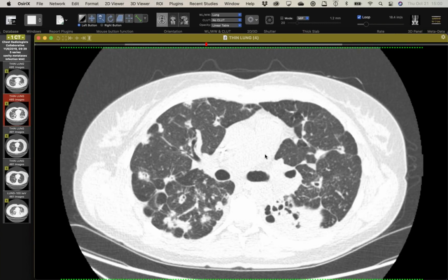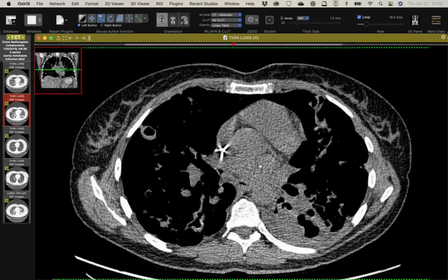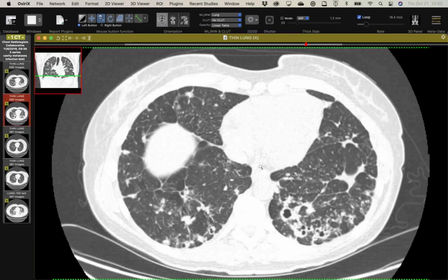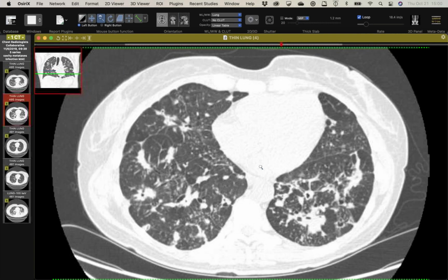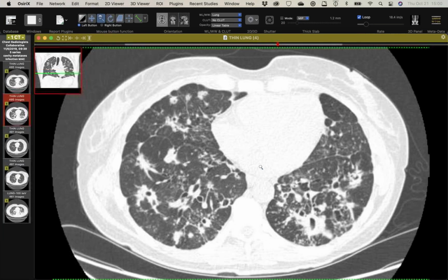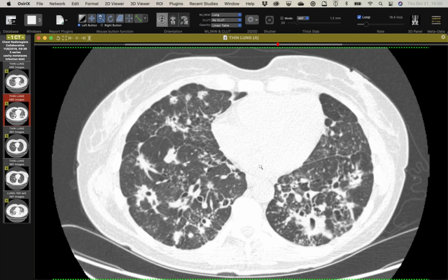Normal. Okay. Yeah, I think she could well be colonized with, say, Pseudomonas. You can get a diffuse small airways sort of thing. It's basal predominant, which is good for infection settling down at the bottom. Just because she's MAC positive doesn't mean she doesn't have other bugs like Pseudomonas. And the other thing is, it could even be MAC that's disseminating in those small airways.